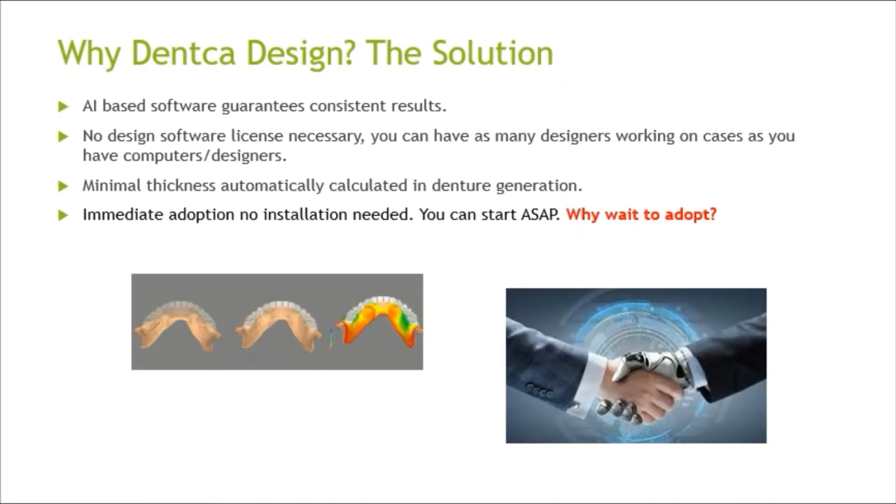Utilizing the DENTCA design solution allows any person out there that has very basic denture knowledge to be able to design a case in a very simple way. It does not require a lot of knowledge. All you have to know is 3 different landmarks and very simple teeth layout setups.